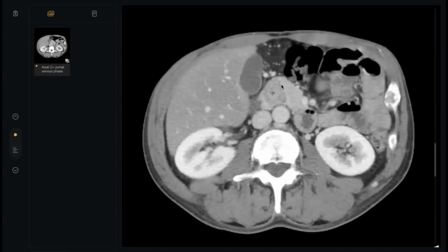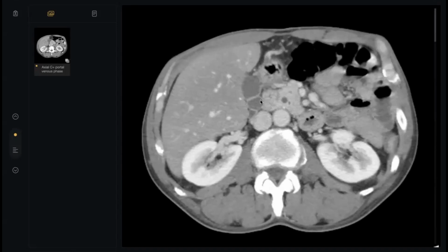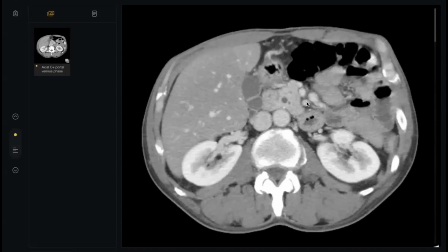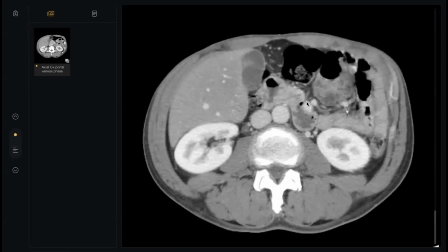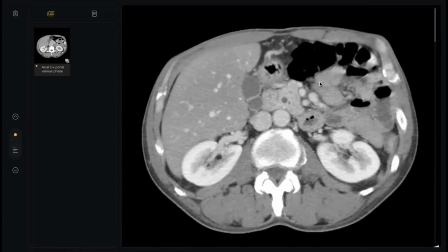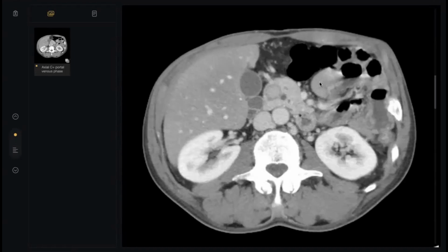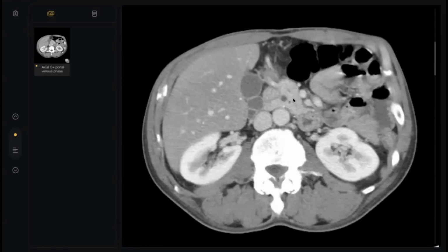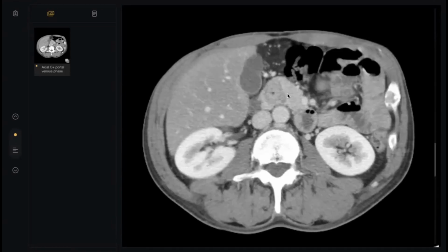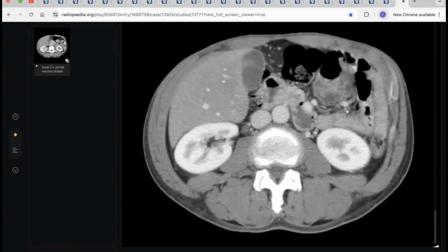Look, my friends, see, this is the duodenum, down, down, down, completely surrounded by the pancreatic tissue. Unfortunately, this is a limited study, and really, I didn't find another one in radiology. But I think this annular pancreas is a very good case. All of us should take care of it. Also, see, these are the two pancreatic ducts. Take care of them because we have two cases related to abnormality in the pancreatic ducts. Next candidate.